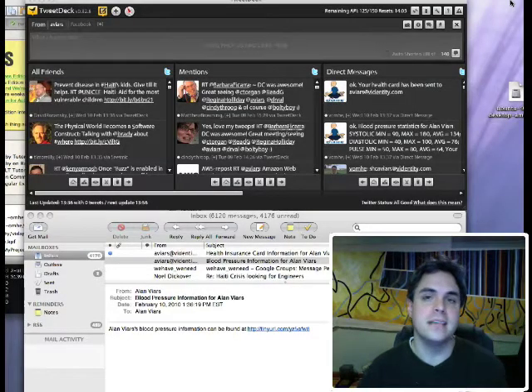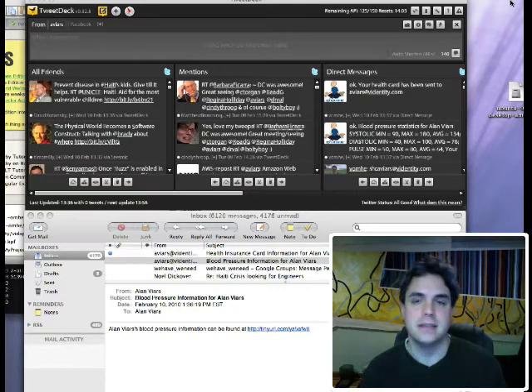Hi, I'm back, and in this section I'm going to briefly discuss what Videntity is doing with mobile text messaging, SMS, and Twitter. And I'm going to demonstrate how you can use Videntity to send medical information or retrieve medical information for yourself. And once again, we're going to use blood pressure as the example.